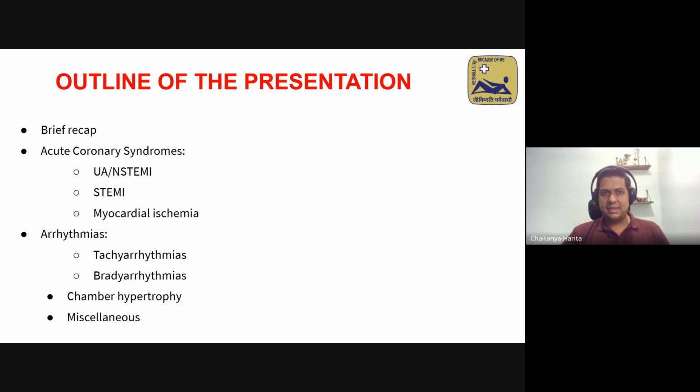As I said in the last class, and I'll reiterate, it's important not to miss a big finding. You miss a small finding, you don't pick up a subtle finding, that's okay. But missing a life-threatening arrhythmia, missing an acute coronary syndrome, however subtle it may be, is something that we should completely avoid. So that's what I'm trying to do in this class. And I've put basically every ECG as a case. So, there's a little bit of history in which you read an ECG, which tends to also add to it. In the days where we look at reports and treat them rather than look at patients, it still becomes critical to look at the patient's presentation when you're looking at an ECG.